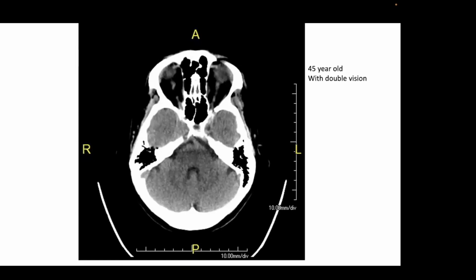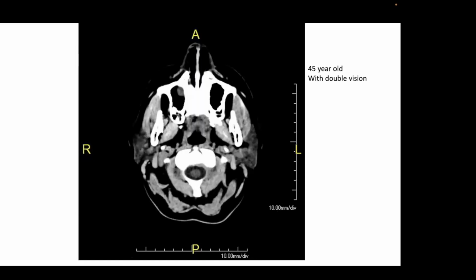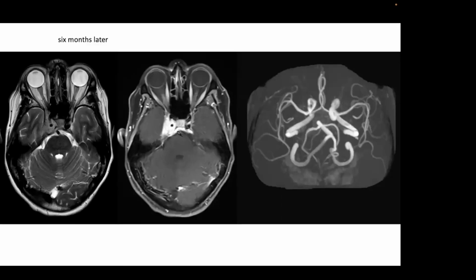I'm going to show you the next. The patient came back. Of course, they weren't happy with not finding anything. And so the patient came back for an MR scan after a while. So here are the findings on this. Susanna, what do you think is going on here?